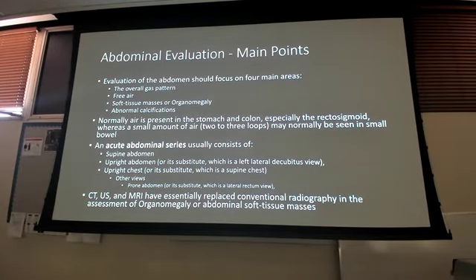How do we evaluate the abdomen? We're going to focus on 4 main areas. The overall gas pattern. What is it supposed to look like? Because again, you can't find abnormal if you don't know normal, right? So what is normal? What should it look like?